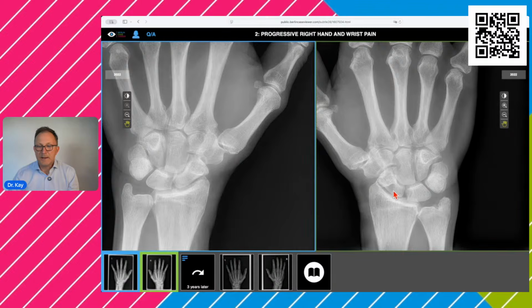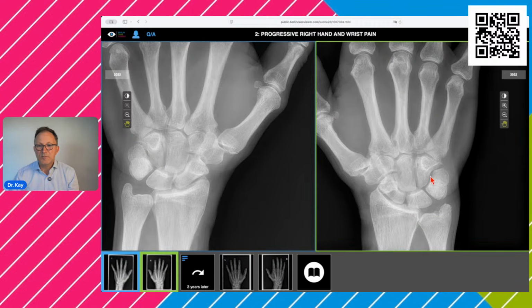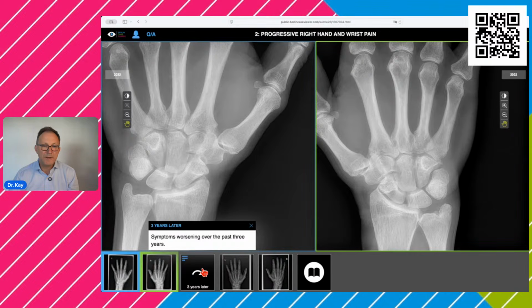And these findings are further underlined by looking at the calcification. So when you see osteoarthritis at the MCP joints, especially second and third, you need to immediately look at the TFCC area, the triangular fibrocartilage cartilage. And there are some, maybe if you look at it on your device, some faint calcifications.